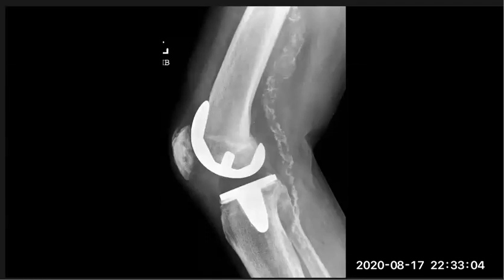And is there any luminal narrowing or not? You can answer these three questions. There is aneurysmal dilatation at the upper part of the image. Okay, there is aneurysm here and a little bit dilated here.